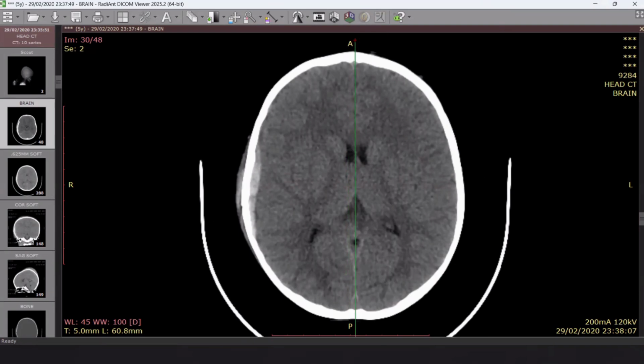Sir, is this at the midline? Yes. Then, sir, next, what will we do? So we'll look for any deviation of the ventricles and the thalami towards the other side, and we'll measure it. Yeah, we should measure from the foramen of Monro to the midline. Yes, sir. So we have here about 4 millimeters. Okay. What else?